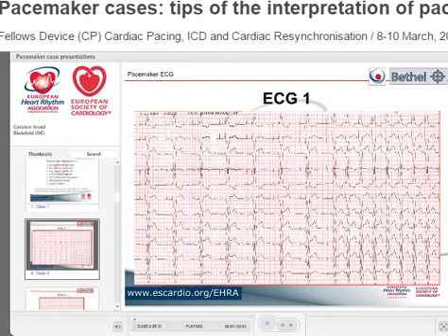I don't have questions because I knew we would never manage this with 45 seconds for you to check A, B, C, D, E. But I think if we go through it all together, everybody will notice that on the left side of the ECG, the rhythm is regular, around 60 beats per minute. And on the right side of the picture, it is still regular, but much faster, around 120 beats per minute.